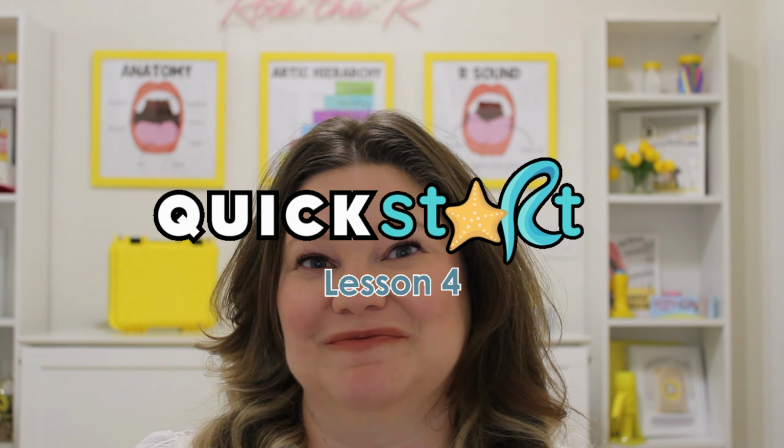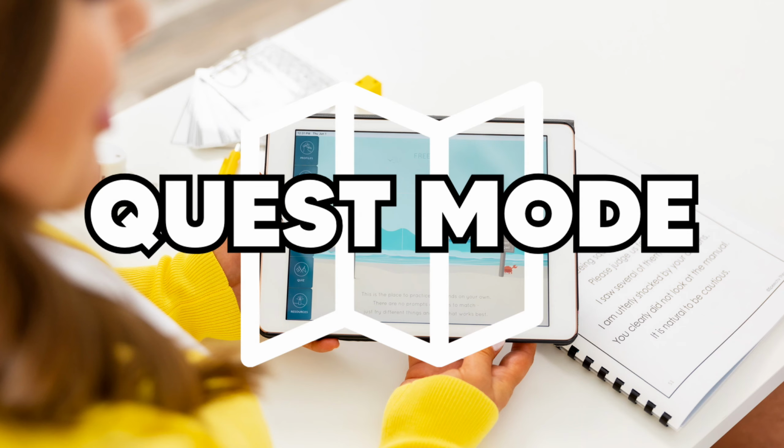If you're looking for a way to make our sound practice more accurate and evidence-based, stick around. This is part 4 of the QuickstaRt tutorial. Today, we're going to talk about quest mode in the staRt app. And trust me, it does all the heavy lifting for you in practice. Let's dive in.